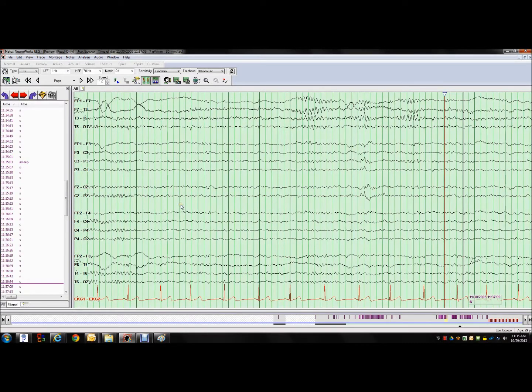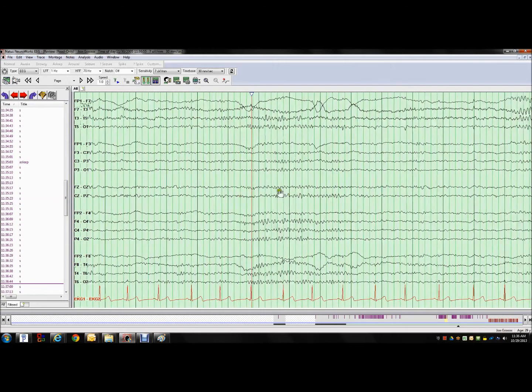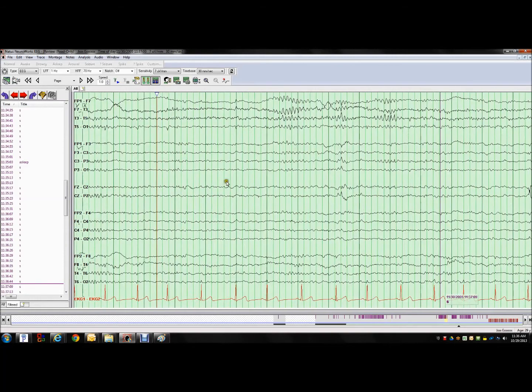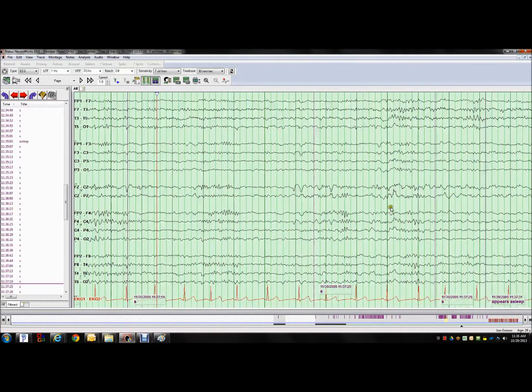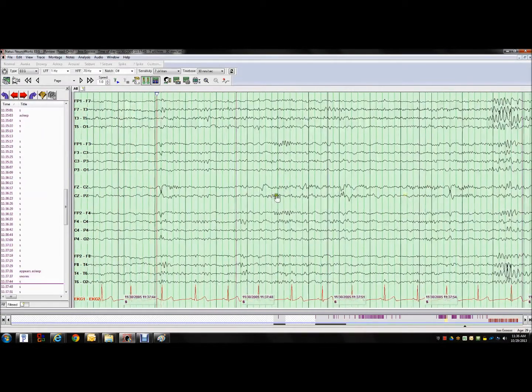Notice that the nystagmus is, for the most part, well, it's interesting. It's still here, right? The patient's not in REM sleep, but you can see that this is a right eye movement. This is another right eye movement. Another right eye movement. Okay, so it's there, but notice when the patient wakes up how much more dramatic those eye movements become. All right, a lot of stage 2.